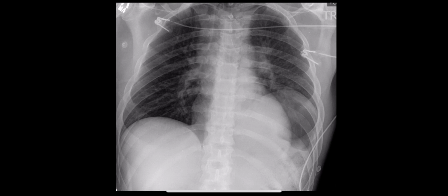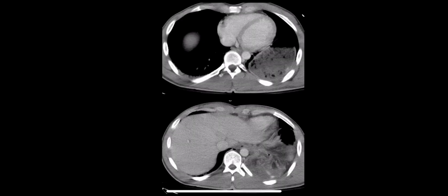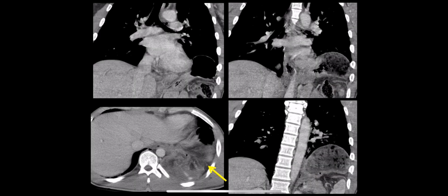In this patient, we see what looks like an elevated left hemidiaphragm, but this certainly could be a hernia on the left. We do axial images in this patient. We see what looks like a dependent viscera sign. The stomach should not be abutting the posterior ribs. And is this a collar sign, this little focal indentation? If we look at multiple coronal reformatted images, we see here the collar sign on the coronal view. So this is clearly a herniation of the stomach through the diaphragm. And then on multiple images, you see this abrupt cutoff of the diaphragm indicating an acute injury of the diaphragm.